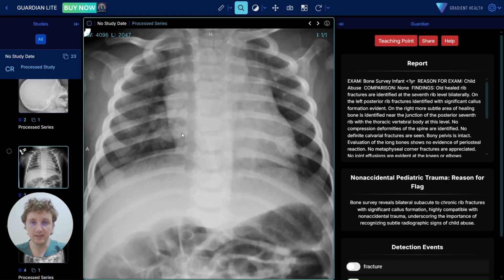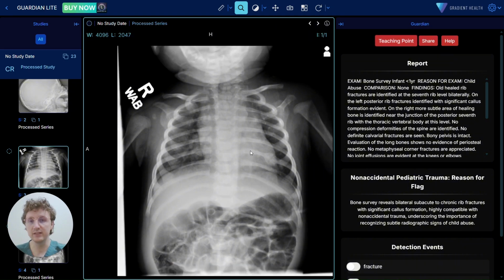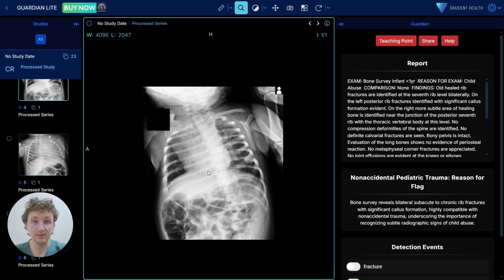As I move along here, I see on this posterior right rib some callus formation, and on the contralateral side, a little more laterally, I see another callus, suggesting these healing chronic type fractures. I'm looking for different ages of fractures, especially to continue to add supporting evidence for our concern of non-accidental trauma. But a rib fracture in this age should always be treated suspiciously, and if the flags aren't already raised, it's the radiologist's responsibility to assist our clinicians in raising those flags.